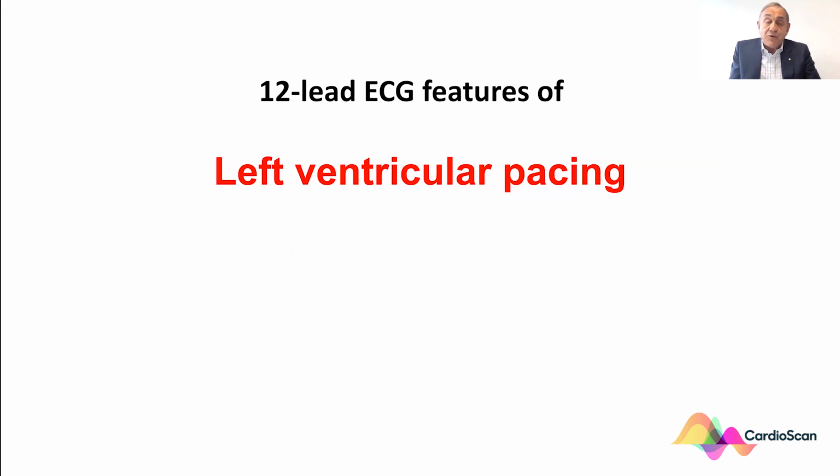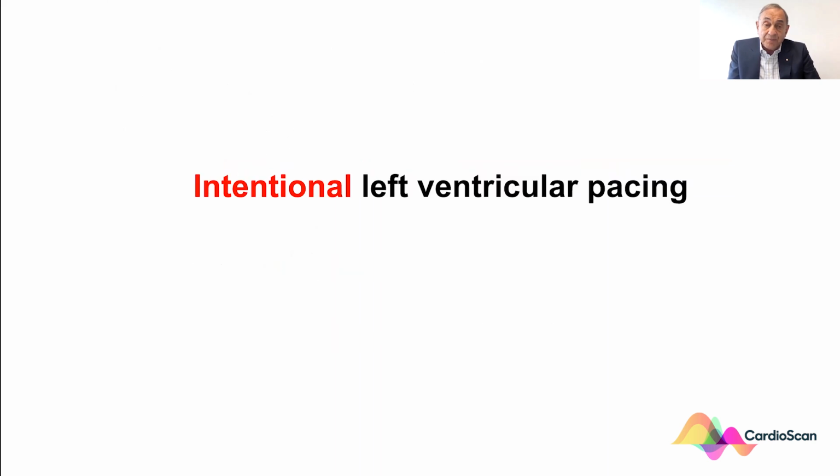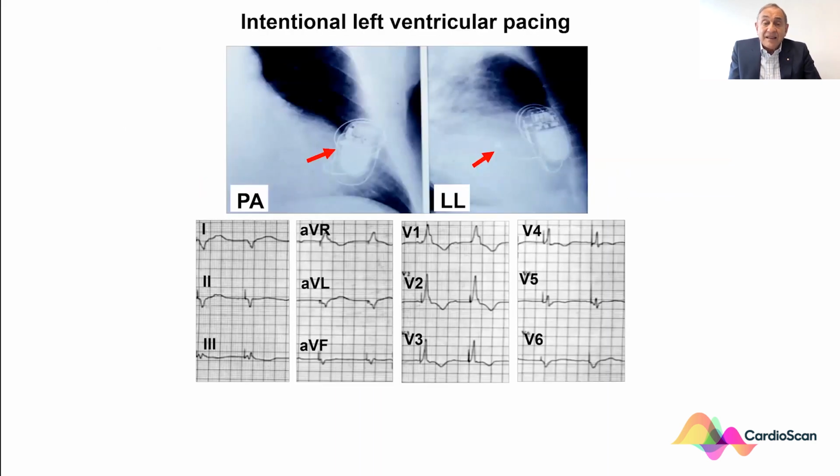What about left ventricular pacing? This can be either intentional or non-intentional. Intentional left ventricular pacing is when you have the lead placed in the left ventricle, and you know it is there.